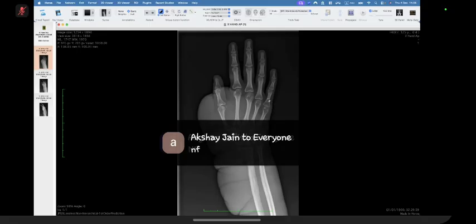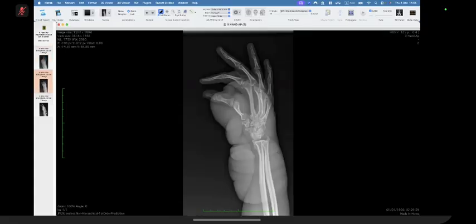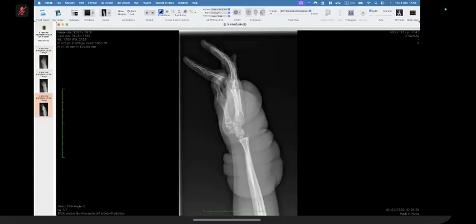Neurofibromatosis. Okay. This is an Aunt Mini. If you've never seen it before, see it now and just memorize it and make sure that you never forget it. I have seen only one case when I was doing Viva, and this is the only case that I've got in my collection.